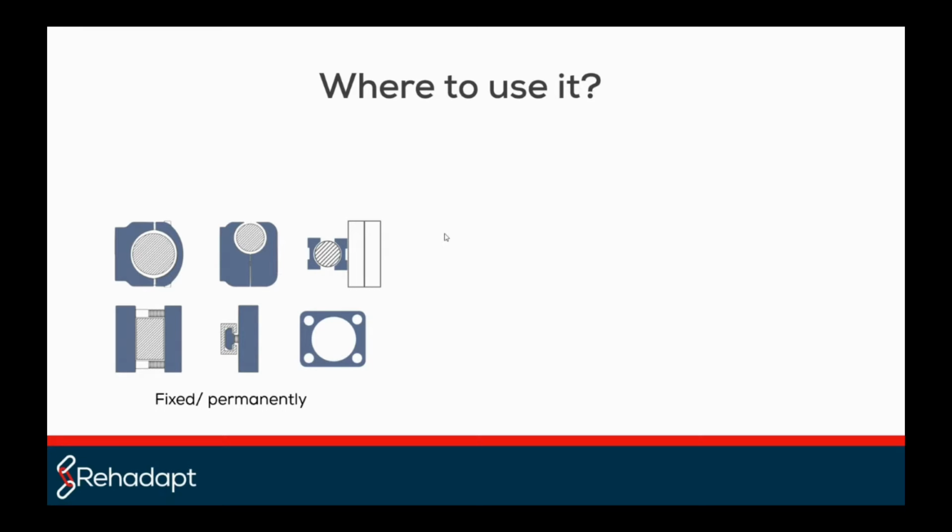So when we are starting on the point when our customers are located in a wheelchair, we often want to have a solution that is sturdy enough and remains all the time on the same spot where the customer can use it. So often we are thinking about a fixed combination of a mounting bracket for a tablet system. For that, we need to have for each wheelchair an individual fixed frame clamp system that we can combine easily with a mounting bracket, with a mounting arm that we can install here to a wheelchair.